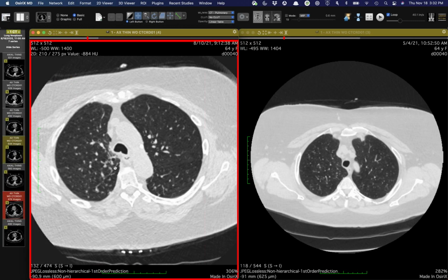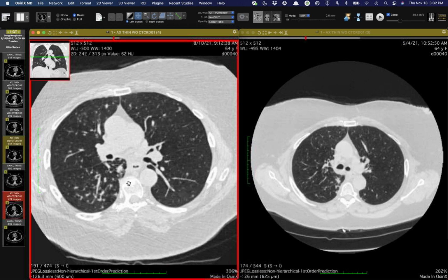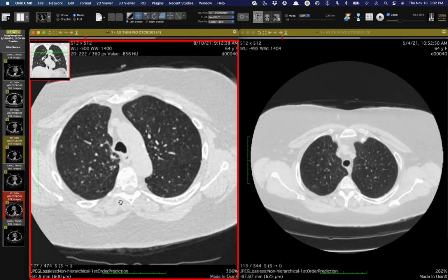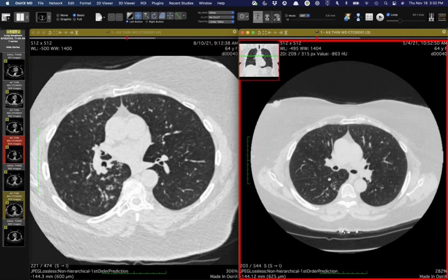And now there's maybe some septal thickening, upper lobes, still asymmetric, right greater than left. They did another bronch, negative, and went to surgical lung biopsy. And what do people think?